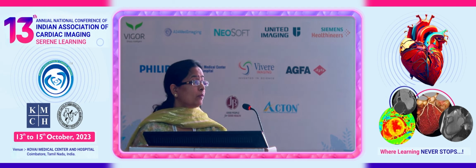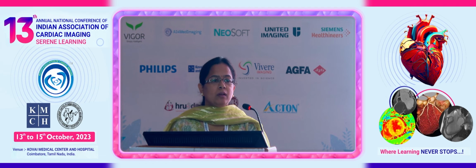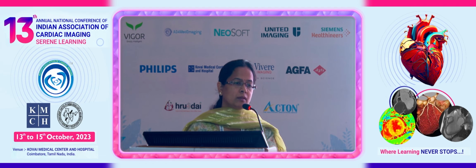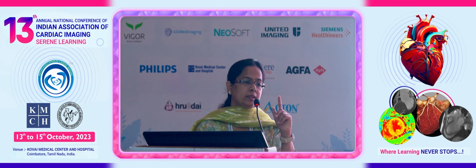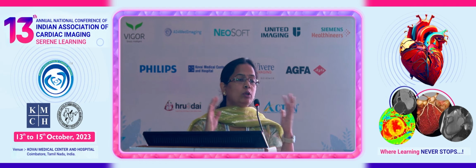Other point I want to mention. The mid cavity was on the anterior and the interventricular septum. All together, when we put it on cine, it was causing this mid-systolic and apical obliteration.